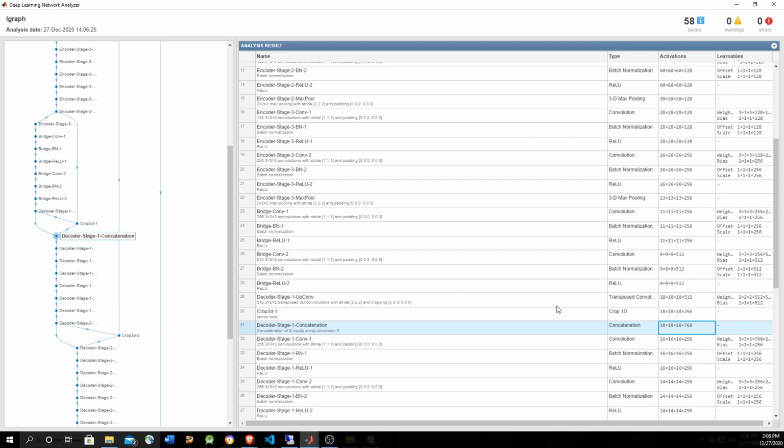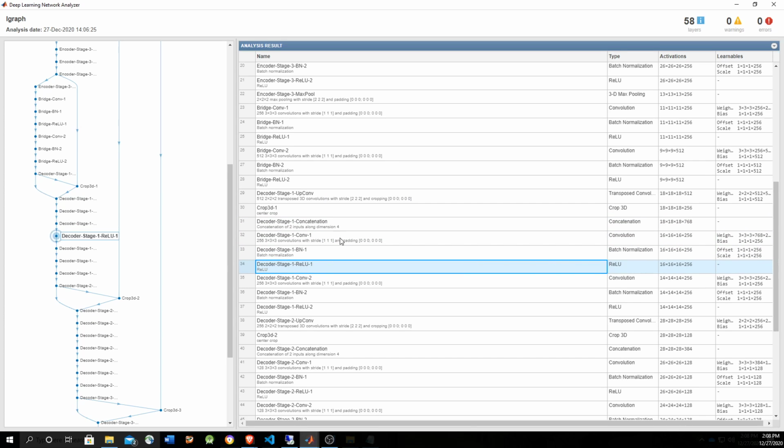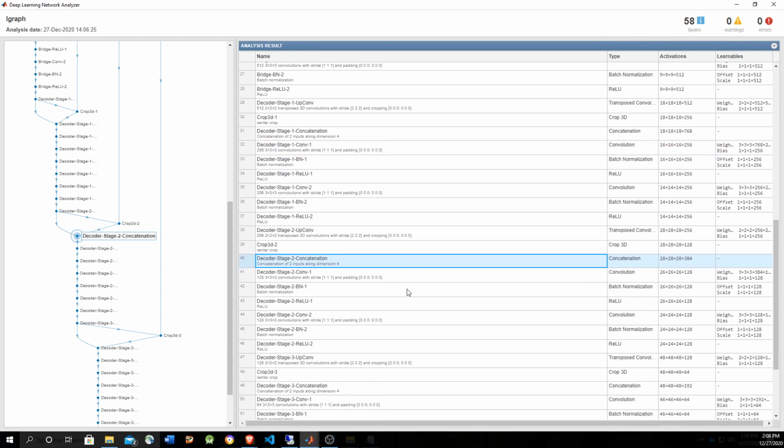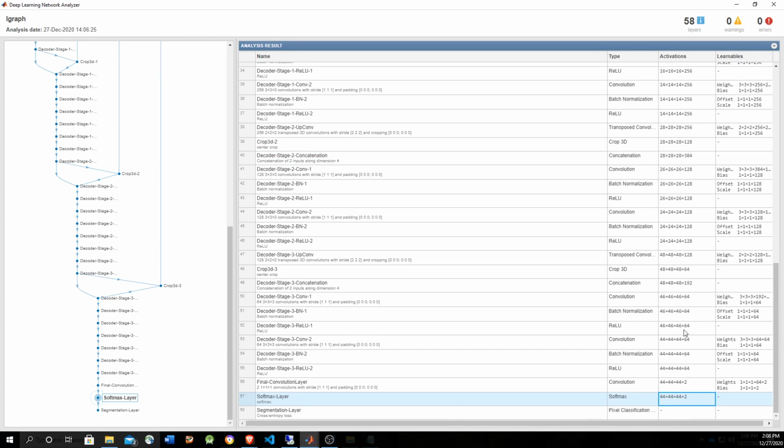And then once you have all your features in here, and you have extracted all the properties of the image, now you have to build it back so you can have the labeled image. So it's going to use again convolution, batch normalization, but it's going to use another variant of the convolution to be able to bring the size of the image up. Okay, so this is the decoding phase, and eventually it's going to get to the size of 44 to the cube. And the output, instead of having a bunch of features, the last dimension is going to be 2. The number of features is going to be 2, and that basically means the segmentation classification of having tumor or no tumor. Notice also that we have a segmentation layer, but we're going to choose another layer for this. We're going to show in a moment.